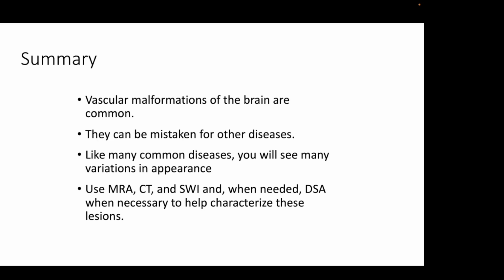And in some cases of developmental venous anomalies, you will see some T2 prolongation in the brain. This is not an indication that it's a different diagnosis. And so just accept that. I would say I've only seen it maybe 4 or 5 times in my career, but when you see it, don't get too excited about it. And use all of these techniques we mentioned to try to characterize these lesions.